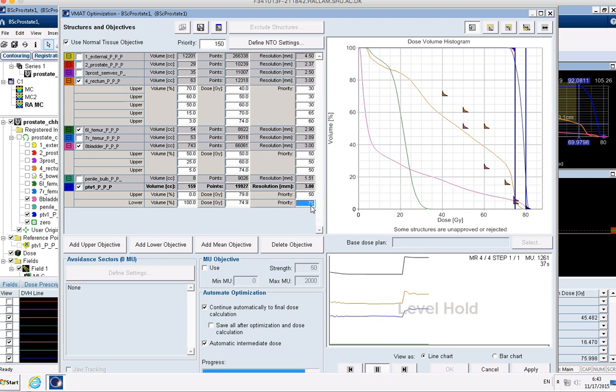So let's let it run at that, and what we might have to do is reduce the priorities elsewhere. So just bumping numbers up doesn't necessarily help. It's very much about, if you increase something, you've got to reduce something elsewhere; you need to be showing it what compromises you're prepared to accept. So it's very much an iterative process, and if I was doing this for real now, I would spend quite a bit of time, certainly in the old days, a couple of hours adjusting this, and so it might take you quite a while to get somewhere close in terms of deciding what's important, what's not.